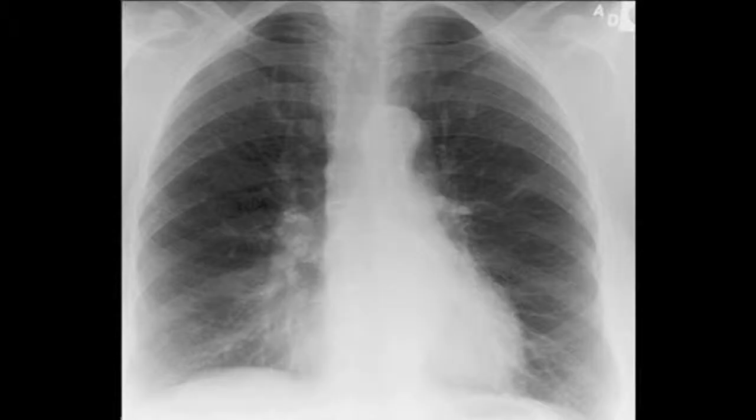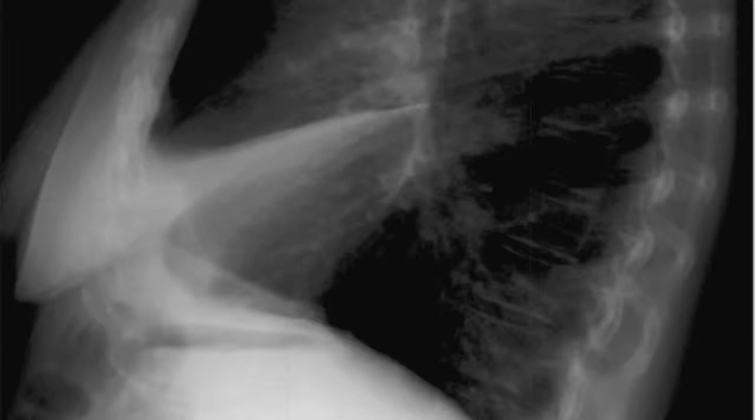Right middle lobe collapse can be quite difficult to spot and may appear like a minor infiltrate close to the right heart border. The key signs include loss of right lung volume, depression of the horizontal fissure, and vague blurring of the right heart border from the hilum to the diaphragm. The appearance is striking on the lateral film as shown here, a luxury often absent in the ICU.